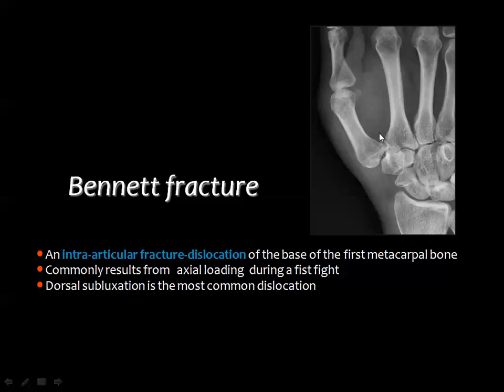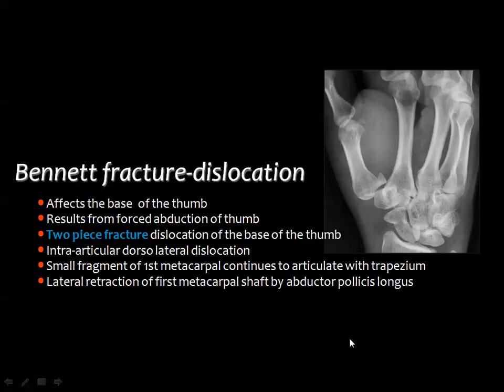And this fracture extends to involve the articular surface of the bone. Involvement of the articular surface is a serious injury and requires adequate reduction, adequate fixation, and early mobilization, so as to prevent joint complications.